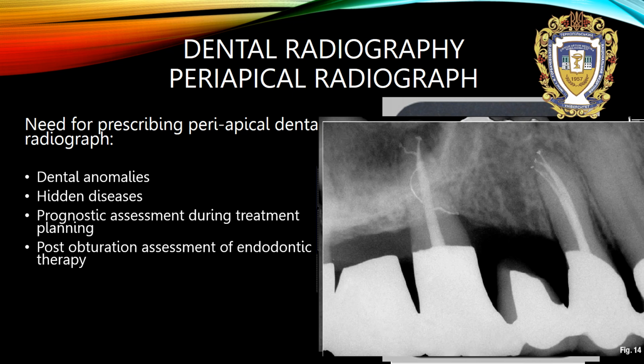You can ask me, what does this white line mean? I think it is a fistula, and filling material passed through the fistula, or maybe additional root canals. I'm not sure.